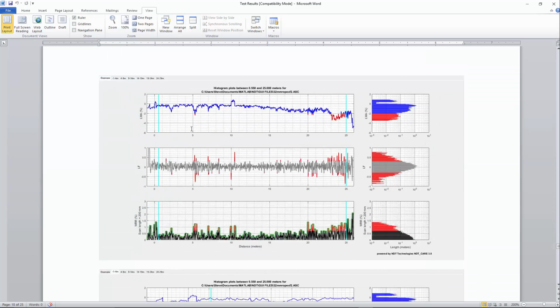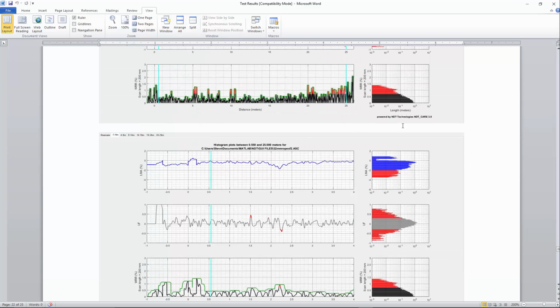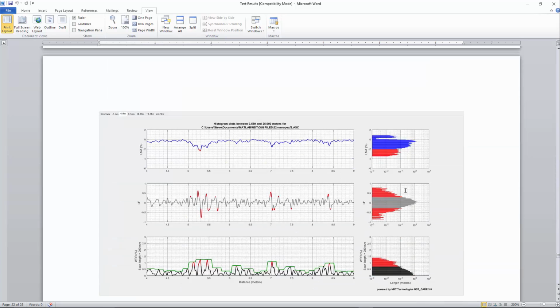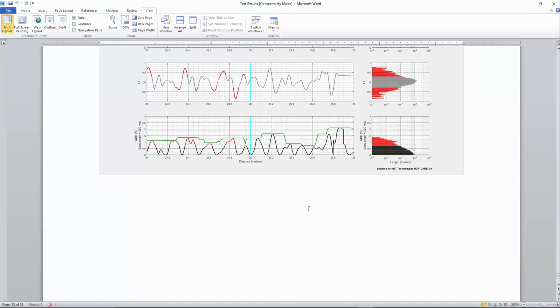And finally the histogram overview with the zoomed. Note that on the histogram, we're only zooming the summary plot side. The actual histogram side will remain the same on all of the plots. Okay, so looking at the bottom left corner, there are 25 pages of all of this.